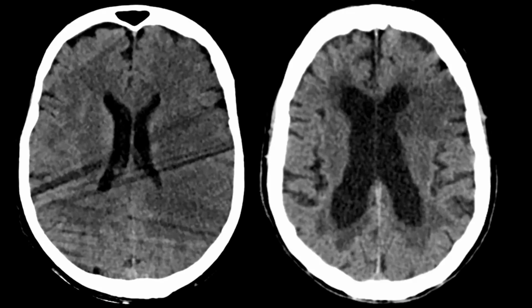Now, the thing is, if a patient has an established infarction, there is nothing that can be done anymore. The goal of imaging is to basically detect patients at an early stage, so when they are still eligible for therapy. And in that stage, the signs of infarction can still be subtle. This is a patient with a large left middle cerebral artery territory infarction, but at a first glance, you really have to look carefully at these images.